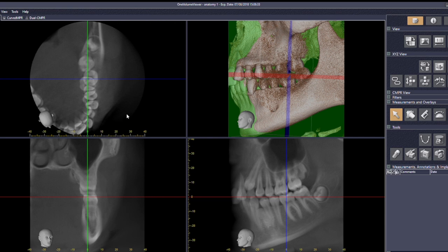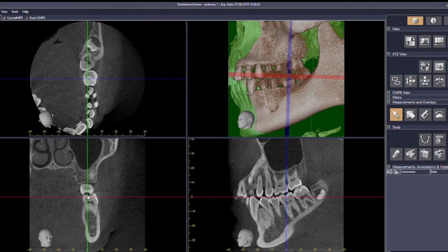So I'm going to right click, go to thickness, go back to 0. 0 will be the finest cuts. You can see that when we go to the finest cuts, it gets a bit grainy. This is totally normal, and it's because we're going for the very finest detail. The analogy to this is if you take a picture on your camera phone and zoom in and in and in, you get this sort of appearance when there are too few pixels.